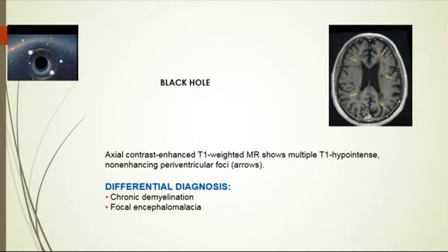It's a burnt out lesion. It's an inactive lesion. The acute lesion presents with edema and enhancement, maybe diffusion restriction. In the chronic stage, there will be gliotic black holes. These are hypodense on CT, hypointense on T1, and non-enhancing. There is a moderate correlation between the development of black holes and the degree of clinical disability in MS. Some correlation: how many black holes and how disabled is he or not? So the more the worse, but it's not a strong correlation, it's mild to moderate.